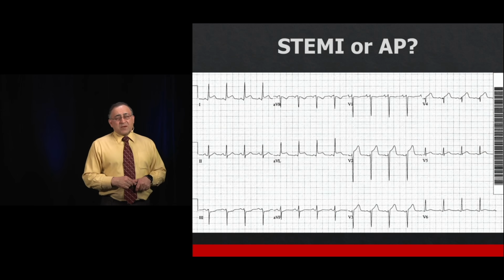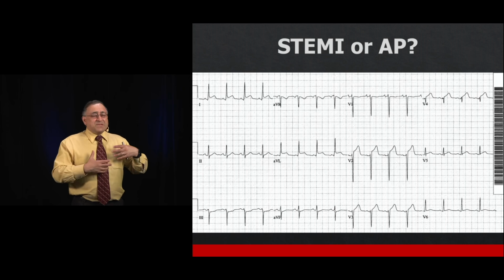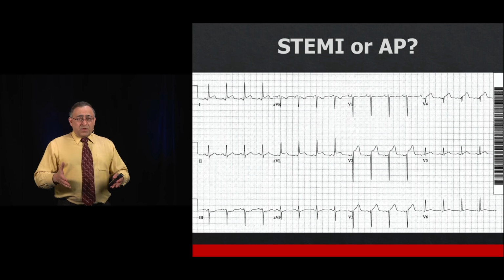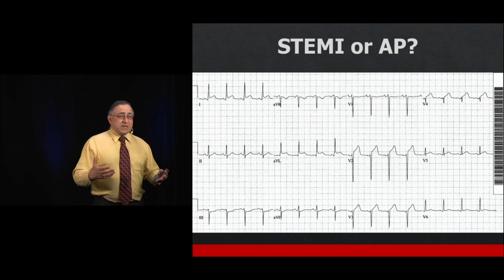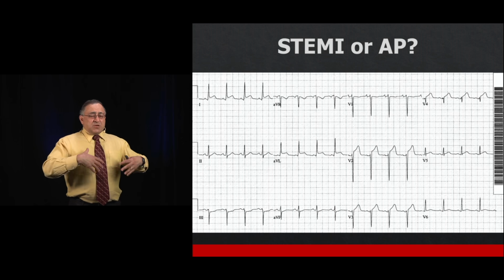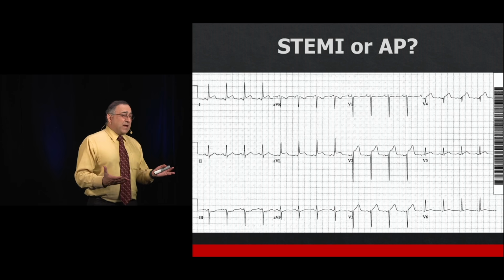This was a 38-year-old woman who really had no cardiac risk factors at all. She came in with a little bit of pleuritic, positional type of chest pain. It's kind of sharp, and she's got this EKG, and the first thought going through the emergency physician's mind is she's only 38, she's a woman, she's low risk. She doesn't have classic pain, chest pressure, diaphoresis or anything. It's sharp and pleuritic. It sounds like pericarditis.